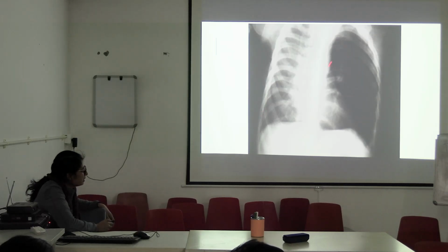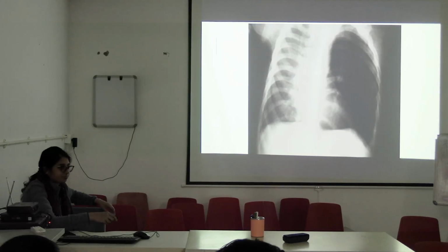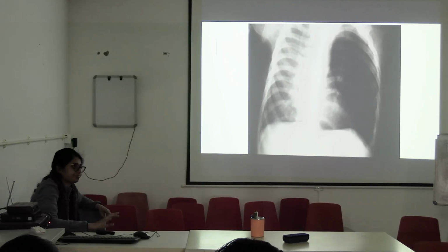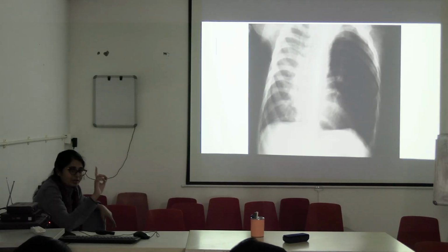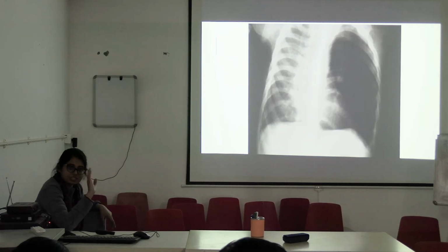Okay, so whenever you are getting a difficult x-ray, just start from the basics. Okay, তুই volunteer, যে পয়েন্টস গুলো বলেছিলাম এই পয়েন্টস অনুযায়ী। আচ্ছা, whenever default এটা মনে রাখবি, whenever you are given to describe a chest x-ray, call it PA. পরীক্ষার সময় কোনো অ্যানালাইসিসে যাবি না, call it PA. অর্থোপেডিকের এক্সরে গুলো যখন দেখাবে এপি। When you are interpreting the lungs and the heart, call it PA by default.